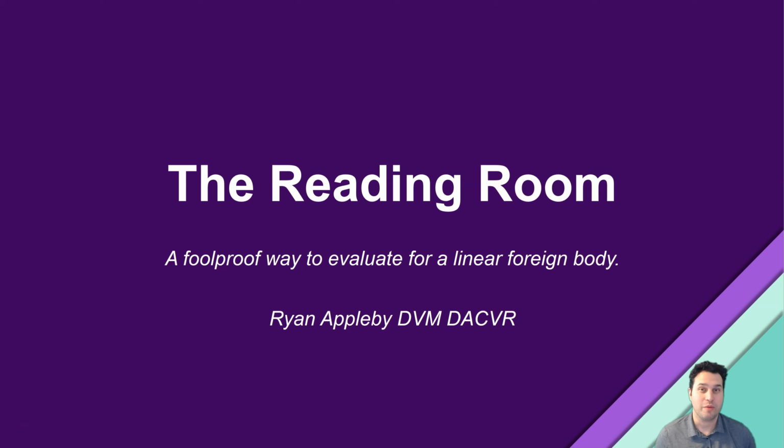This week we're talking about linear foreign bodies. I want to make it so that you can diagnose a linear foreign body in a dog with confidence every single time. So let's jump in.